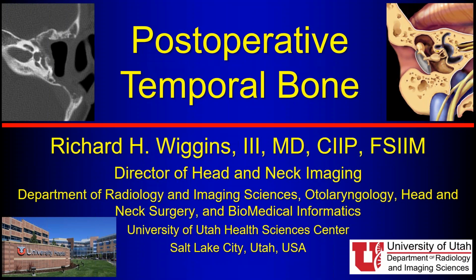For the other pathologies, if it's not something that shows restricted diffusion preoperatively, just like all the brain tumors, complicated cases that we have, we need to go back and look at the preoperative or pre-therapy imaging to see how the pathology looked on cross-sectional imaging beforehand when we compare our post-operative imaging to that. Just like the complicated chondrosarcoma case I showed, you can't just look at the post-operative, you have to compare it side by side with the preoperative to really understand what's going on in this complicated anatomy around the temporal bone. So I would say, yes, there is definitely a role for cholesteatoma cases.